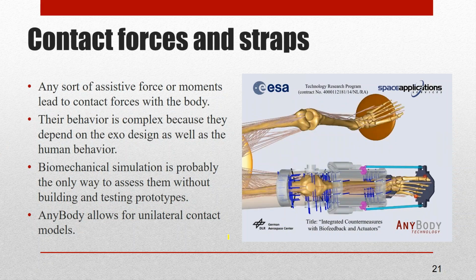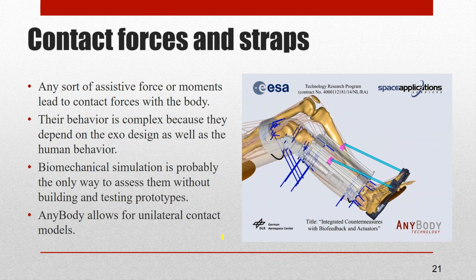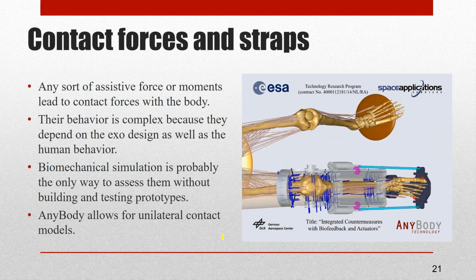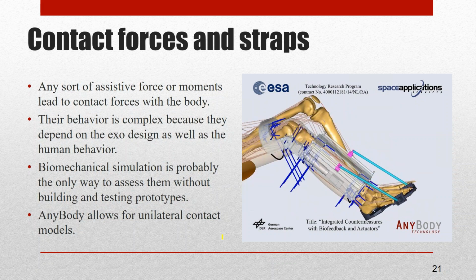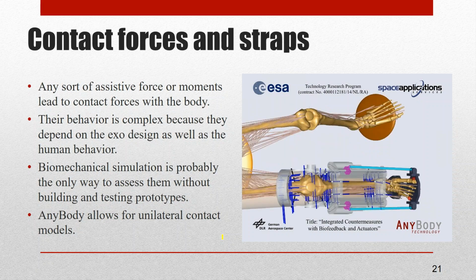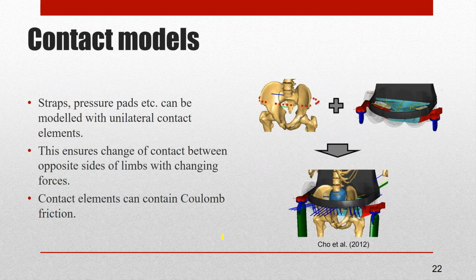The way we model that in AnyBody is by means of the same types of algorithms that we use for the muscle recruitment, and since those algorithms are already in AnyBody and are very efficient, it means that you're not adding a whole lot of layers of complexity from a mathematical point of view to the model when you define these contact points. So AnyBody actually handles those very, very effectively. Here's another example of those types of contact forces where you see the perpendicular forces and the parallel friction forces over here on the side.